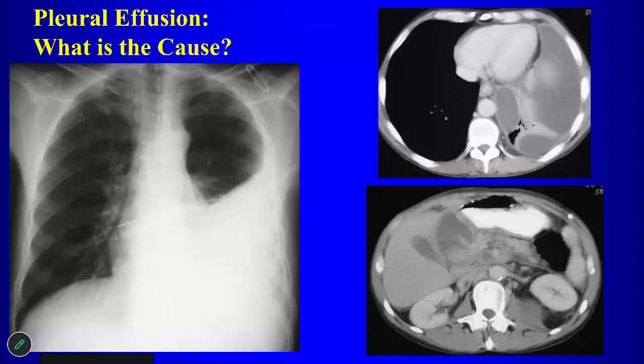First of all, do you think that's a transudate or an exudate? Yeah, it looks more complex. So what is it that makes you concerned about this being more of an exudative effusion? Loculated, right? These are adhesions. Also, the pleura itself is thickened, right? You have pleural thickening here. What do we think is going on in this patient?